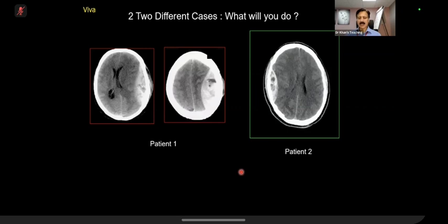Okay, this is a critical thing to pick up. You see, the point is that you are an on-call radiologist. You pick up this extradural hematoma. Within an extradural hematoma, if you see this low density, this is known as the swirl sign, which means that there is active bleed going on. This is how you infer it. Don't confuse it with the subdural hematoma.